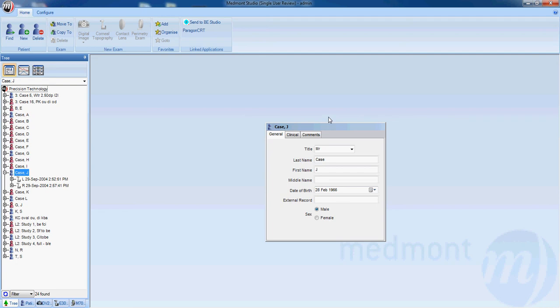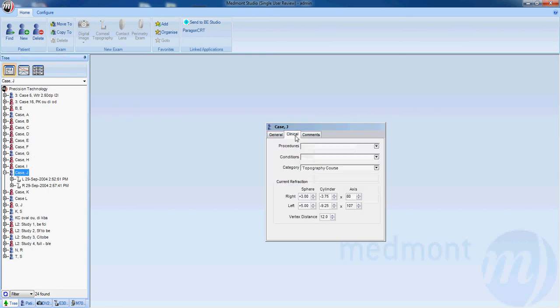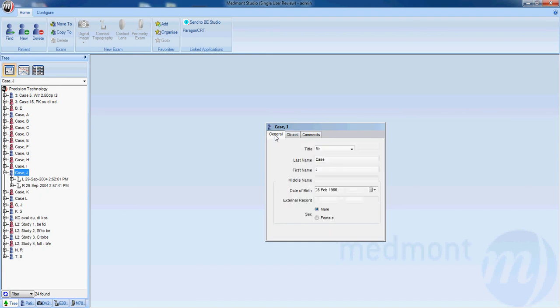This is video 10, a review of everything discussed throughout the video series, and it's intended to be an overview of use with your Medmont E300 Corneal Topographer. If you click on the patient name and the clinical tab, you can enter in the patient's spectacle RX if designing a rigid lens from your Medmont software. With the home icon selected, you can capture topography, create new patients, delete patients.